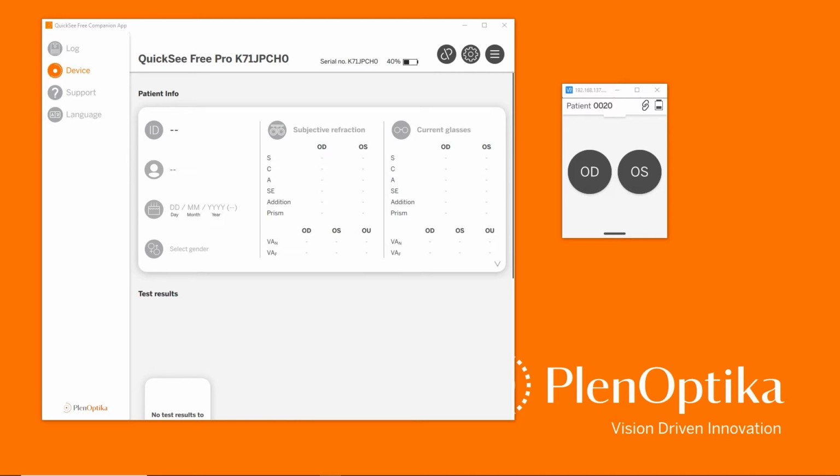Hello! In this video, you will learn how to use the QuickSee Free Companion App. The Companion App allows you to adjust the settings on your QuickSee Free, manage patient measurement records, analyze advanced wavefront refraction metrics, and generate patient measurement reports. If you haven't already installed the Companion App and connected to your QuickSee Free, please see our video about that.